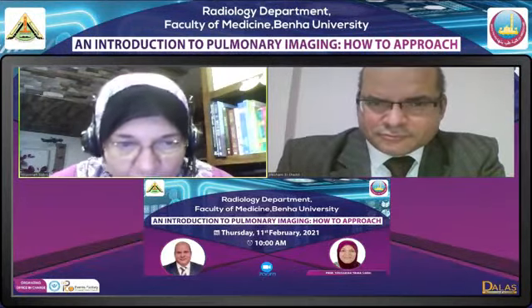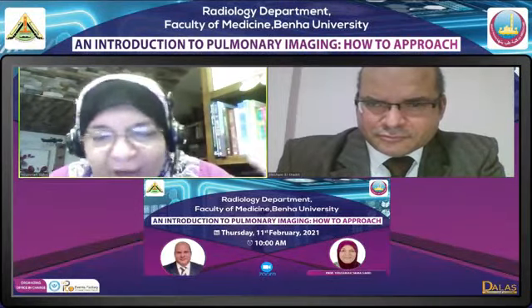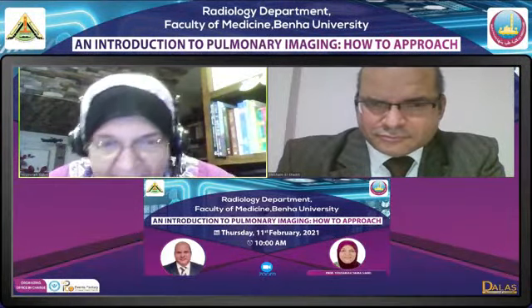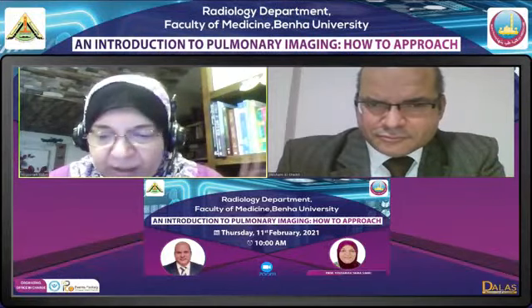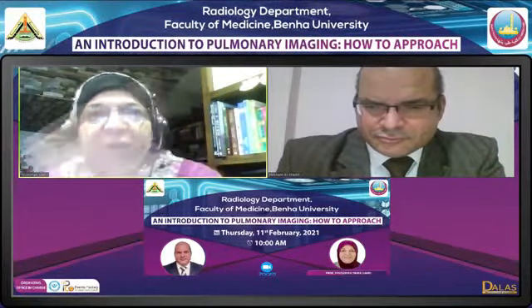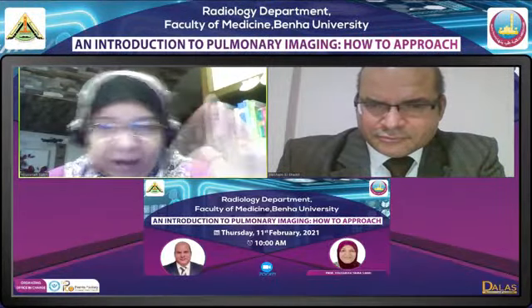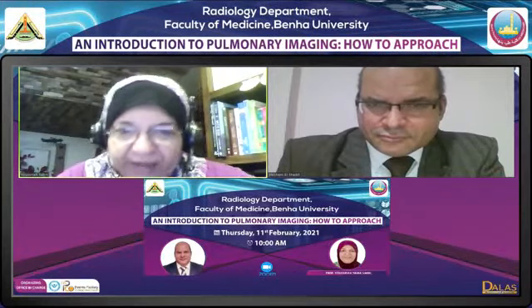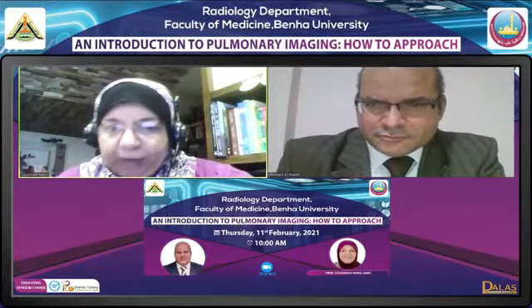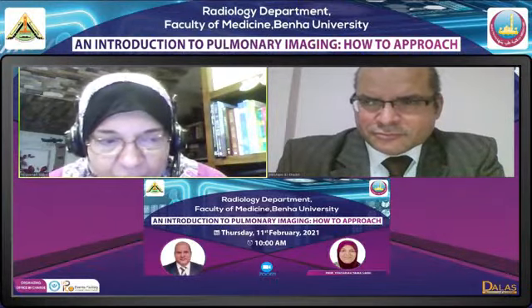تمام، ومكانهم لازم سب بلورال، ومكانهم السب بلورال ده أكتر حاجة تحت وفيلينج ذا بلورال ريسيس. يبقى ده منظر الهاني كومب، وهو بيبقى بايلاترال وفيرلي سيمتريكال بيكوز إم ديلينج وذ إن انترستيشال ديزيز. يبقى طلعنا الهاني كومبينج من الحكاية كده: بايلاترال فيرلي سيمتريكال سب بلورال بريدوميننتلي بيزل كلاسترز أوف سيست. نطلع من دي ونشوف بقى إيه.